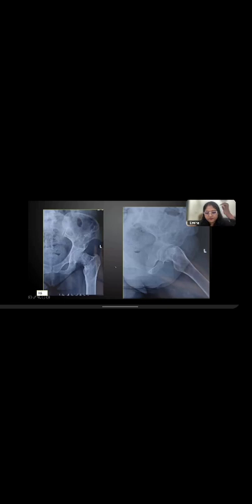So this case gives you the importance of always taking two radiographs, which should be at 90 degrees to each other. So eccentric cortical thickening with no periosteal reaction, or with a solid kind of periosteal reaction, and only on CT maybe you'll be able to see the lytic nidus. Right, case 16.